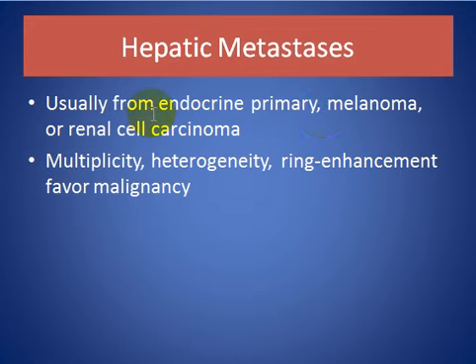Hepatic metastases, usually from the endocrine primary, melanoma or renal cell carcinoma. Multiplicity, heterogeneity, and ring enhancement favor malignancy.